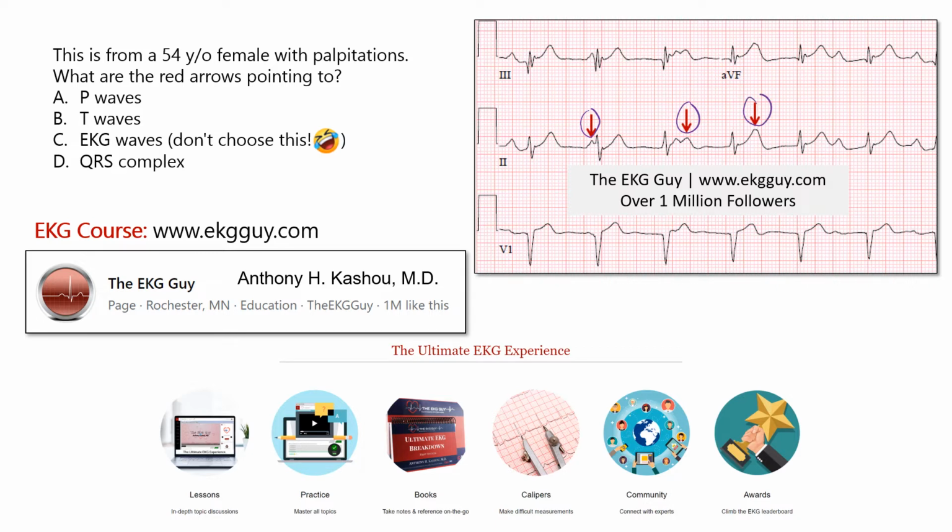A, P waves, B, T waves, C, EKG waves. Don't choose that, so I pretty much gave you a freebie. That is not the correct answer, so we will already cross it out. Or D, QRS complexes. So why don't you try it if you haven't, and take a few moments to see if you can figure it out.